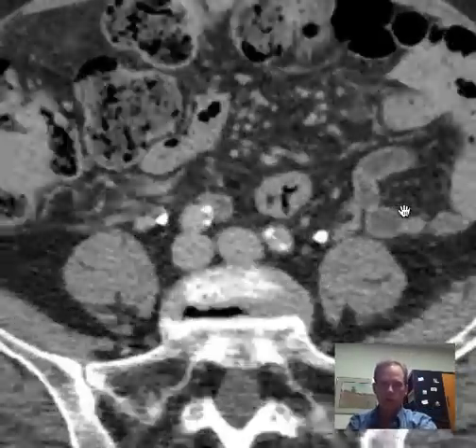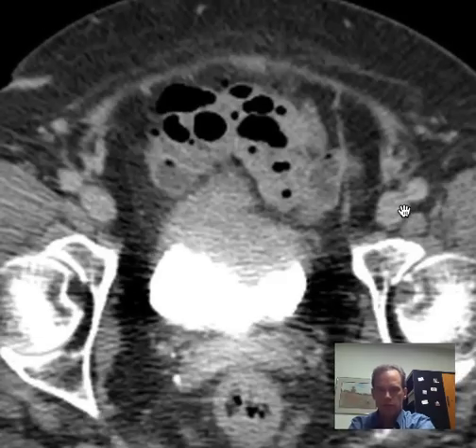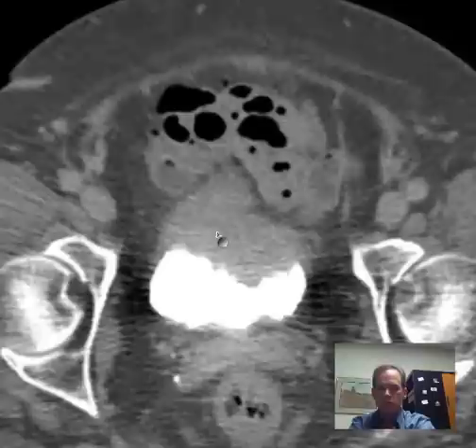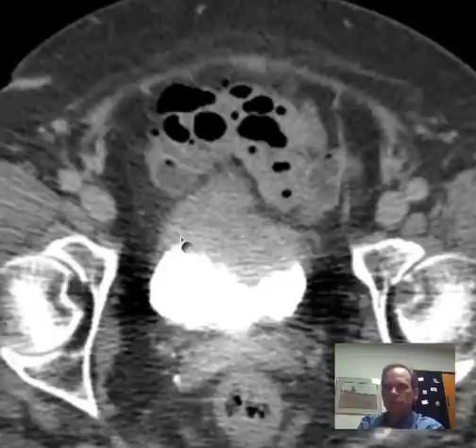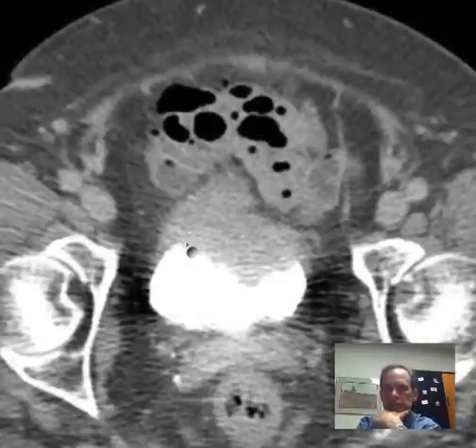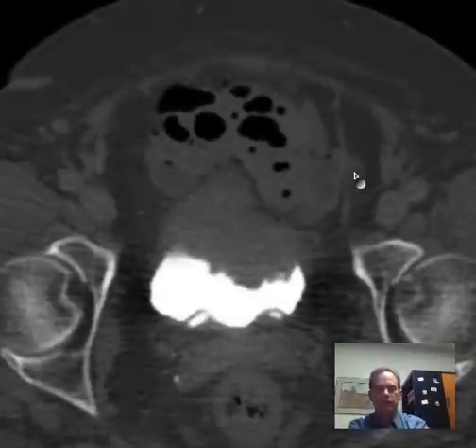So then, what is it that we have down here that I am leading you toward? How would you describe the appearance of this bladder? Well, if we change the windowing, suddenly you can see a little bit more clearly what's happening. It's almost like you need sunglasses for this setting. But if you look here, you'll say, okay, I see a urinary bladder like this.